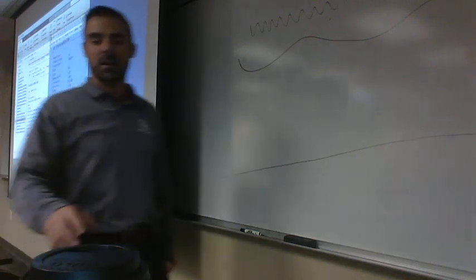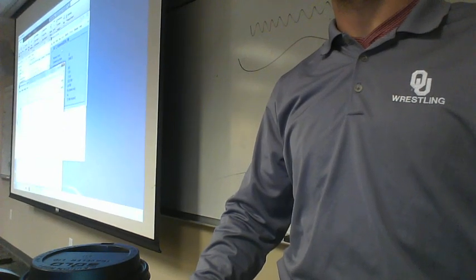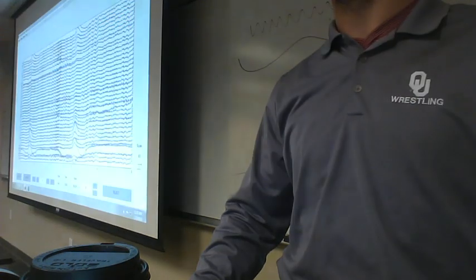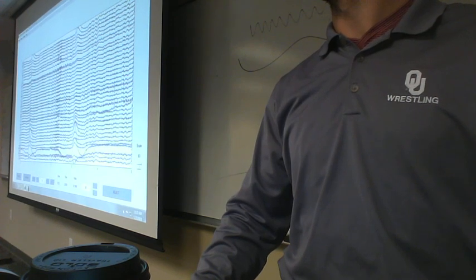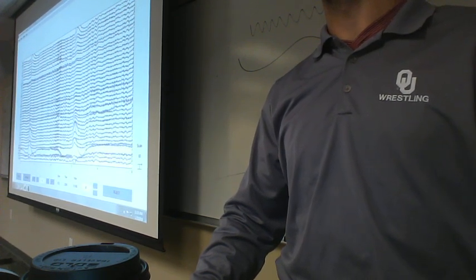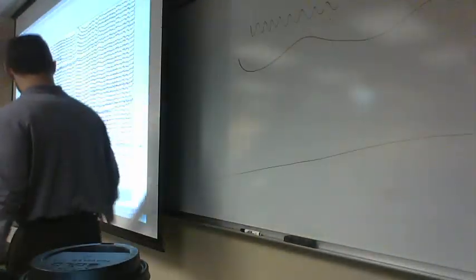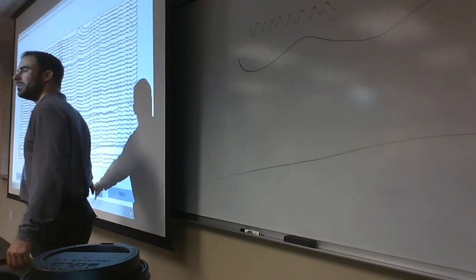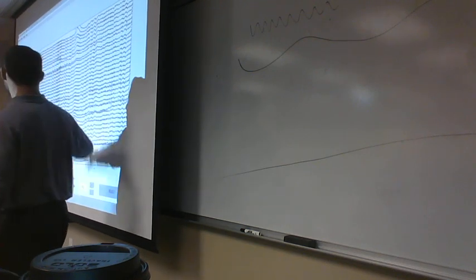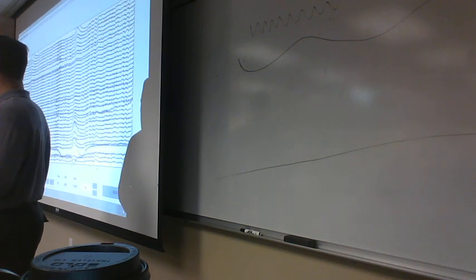So let's just go back with that data and just go plot channel data scroll. Oh my gosh, what happened? Pretty cool, right? So we can see the effects of our processing. Okay. Look at our scale. Now we're back at 83. And we have all of them on the same page. Does everybody have something that looks like this?